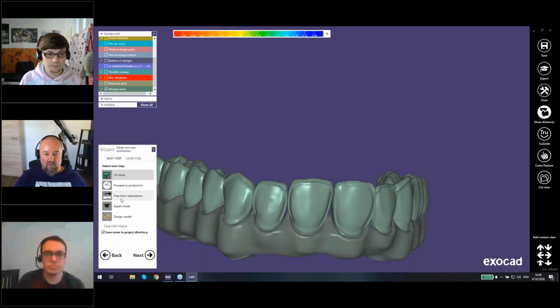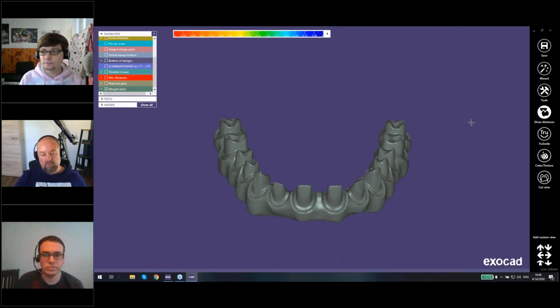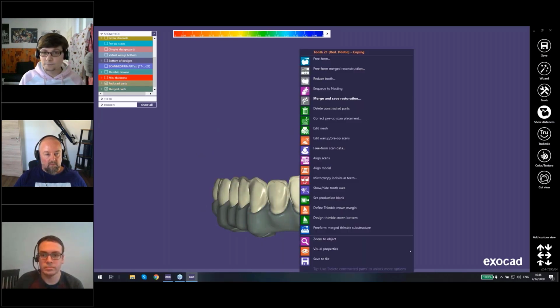I'm just switching. I think so. I don't see the option at the moment to connect them here.